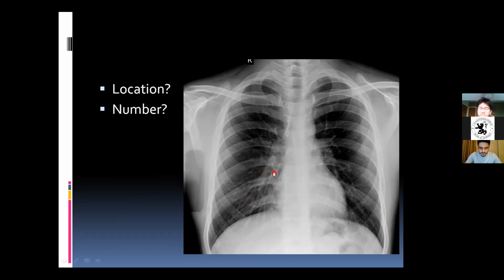And this is very characteristic of a chronic fracture. Okay, the previous 2 that I showed you were more acute. You can actually see the fracture itself. In this case, the fracture has kind of healed itself, but you can still see there's a little bit of a gap over there. And if you paid a little bit more attention, there's also a little bit of a gap in the 8th posterior middle part of the rib as well. Okay, so these are all chronic fractures that are trying to heal.